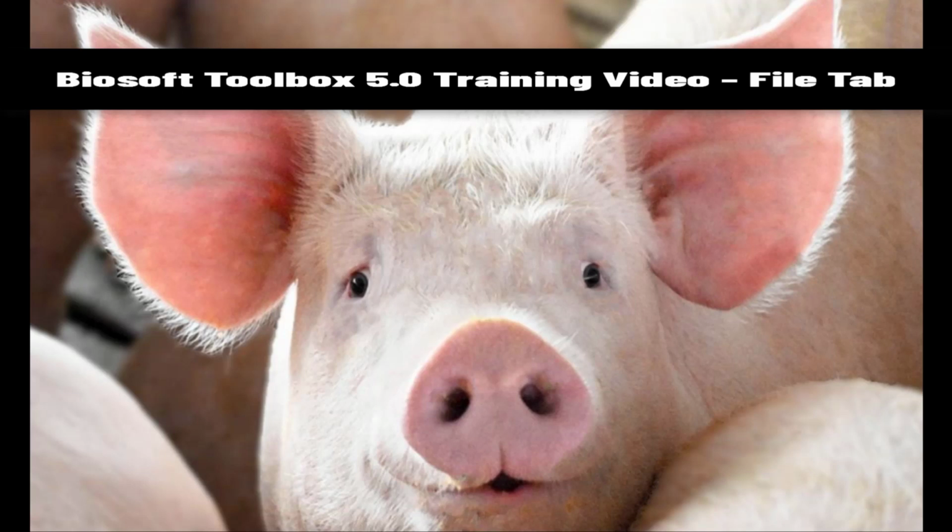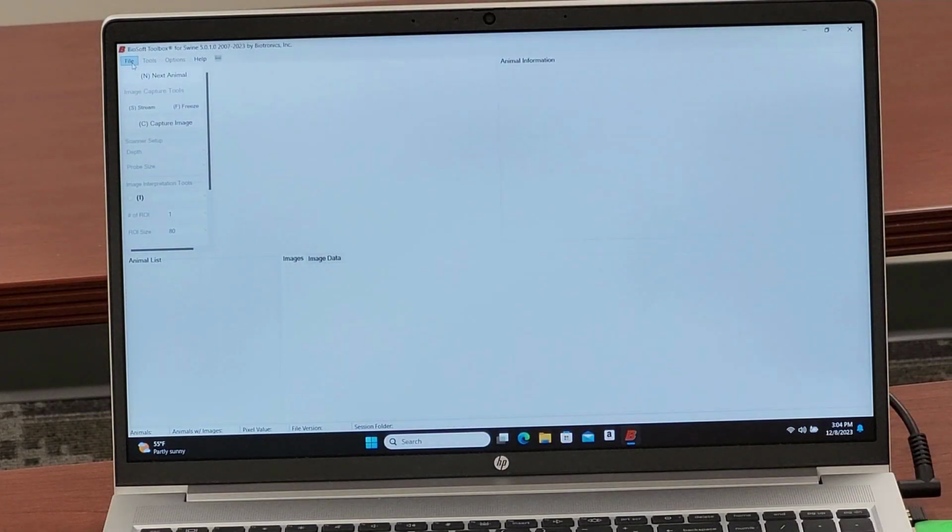We're going to be looking at what are the options with the Toolbox 5.0 software. As we go across here, the first option we'll look at is the file option. We click on file, we can start a new scan session, open an existing scan session that is already on your computer. Open a remote session is something that if you're wanting to do online certifications or something like that with Biotronics, we can set that up for you.